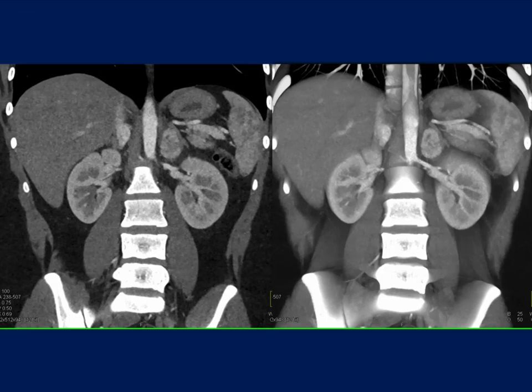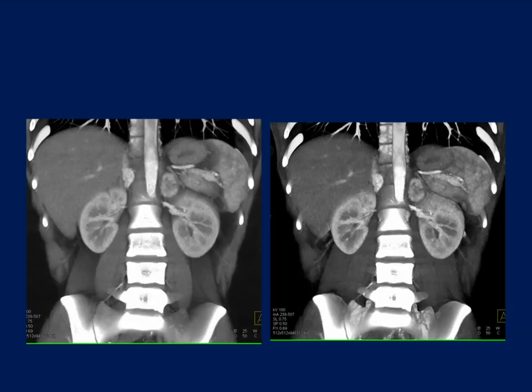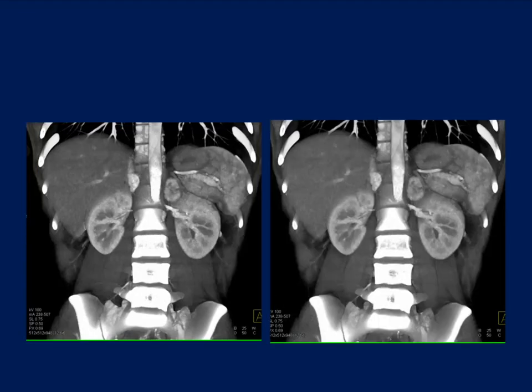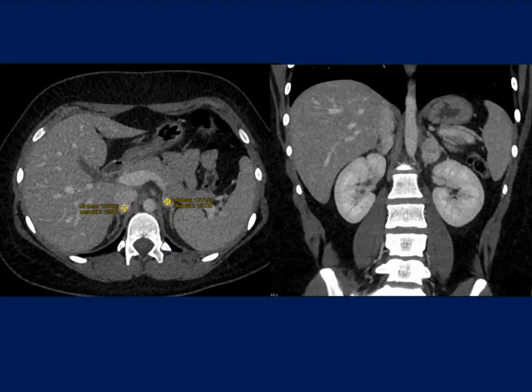And again, as I mentioned, the cases with syndromes, that's 10% of the cases, so it's the less common. But again, if you have a known syndrome, think about that possibility. Again, just a few more images showing you this. It's a case I really like and showed you a lot of images of. And again, the washout, pretty impressive washout.